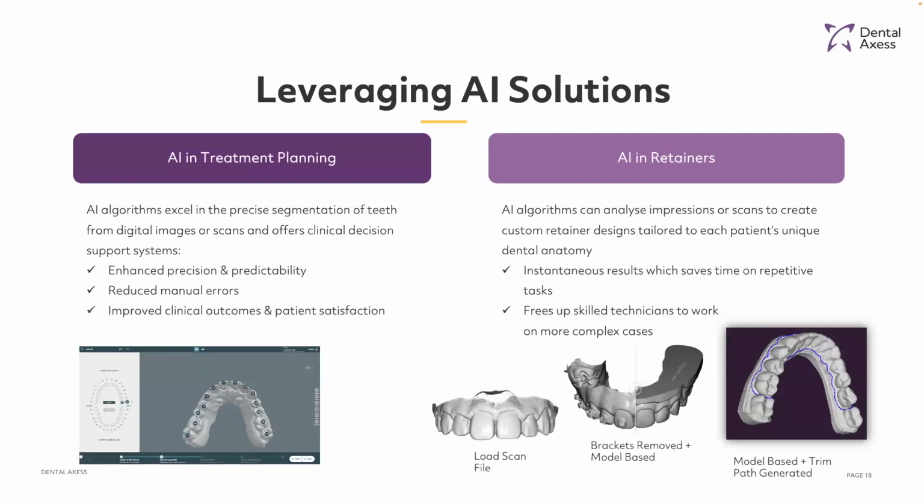Dr. Tania was showing a version of Vision that we're currently using. However, there's a new one coming out in the next month. Within this platform, in the new update, you'll be able to have assistance in segmentation.